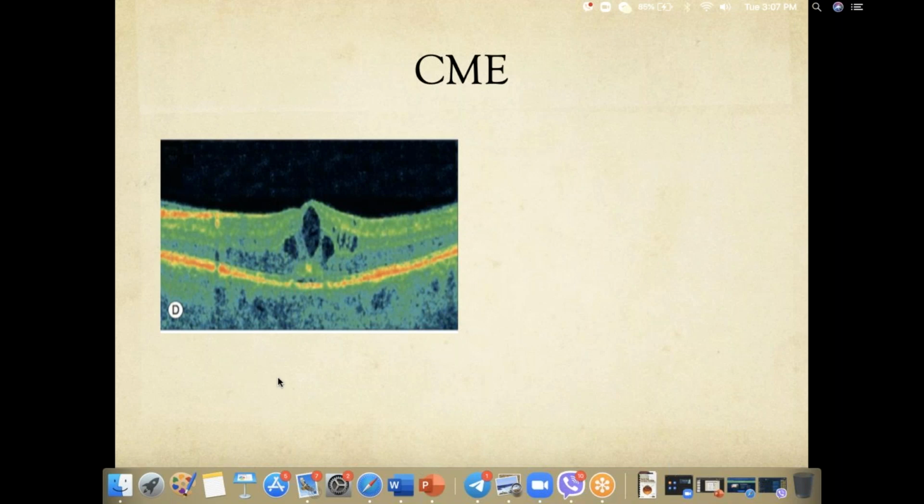Also, another thing to consider is that over here the hyperreflective band is missing, meaning the rods and the cones in the fovea. Sorry, the fovea does not have any rods, only the cones. It's absent, right? There's something hyperreflective over here, which I would presume is a foveolar plaque, a hard exudate, just in the subfoveolar cyst.